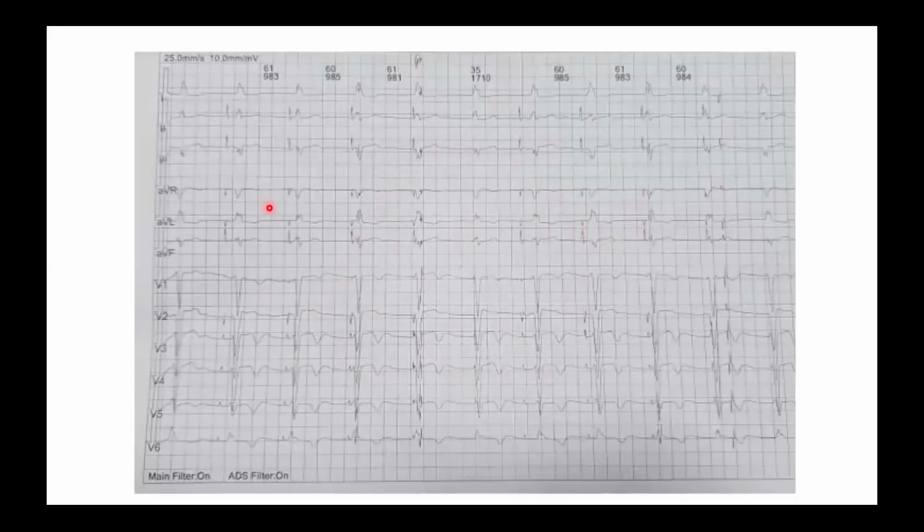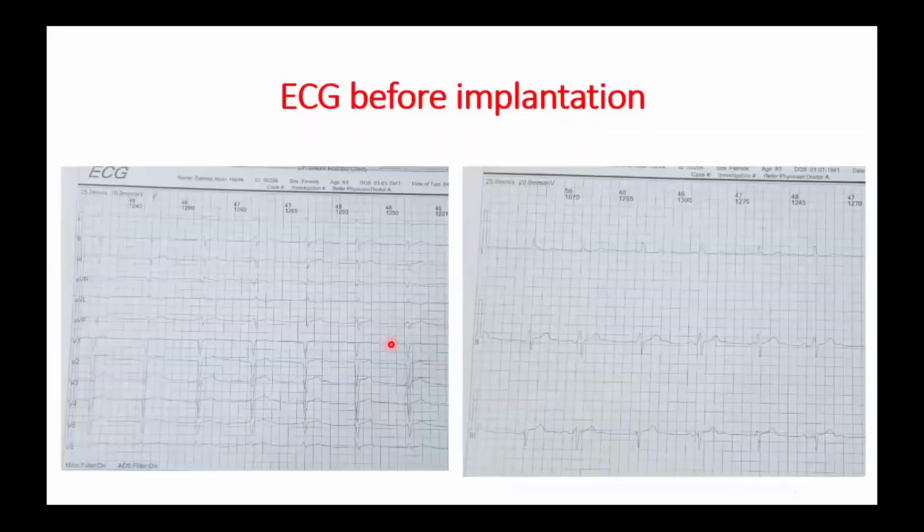What can we appreciate in this ECG, and how to solve this problem? Dr. Hammam, this is a very tough question. I know we could not solve this problem easily. First ECG, please. First ECG, okay.